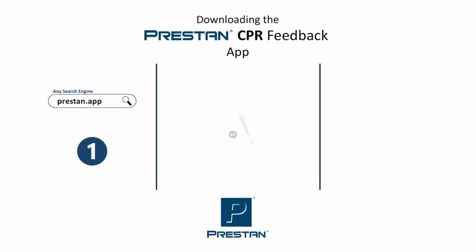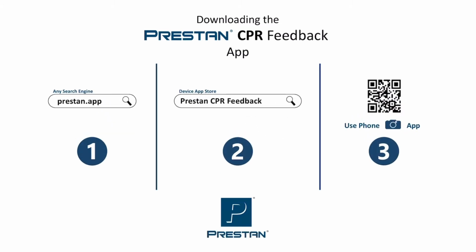The PRESTAN CPR feedback app provides high-quality, real-time, advanced CPR feedback via a Bluetooth connection with the PRESTAN Professional Adult Series 2000 mannequin. Advanced CPR feedback, which includes rate, depth, recoil, ventilation, and hands-off time, is monitored, easily displayed, and available for reporting, allowing students to self-monitor performance and gain confidence during CPR training.